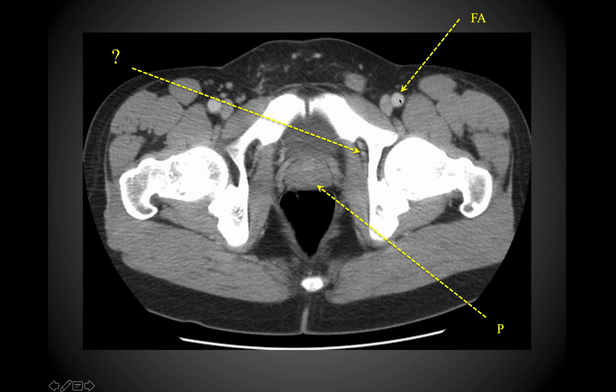And in this image we can once again appreciate the femoral vein and the femoral arteries, or femoral artery and vein. You can see those on both sides here. You can also appreciate the prostate. So we're getting to the lower extent of the bladder, and so you get a good relationship between the rectum and the prostate, so you can get a good sense of why it's so effective to do a digital rectal exam in order to palpate the prostate for presence of either benign prostatic hyperplasia and or tumor, carcinogenic tumors, neoplasms.